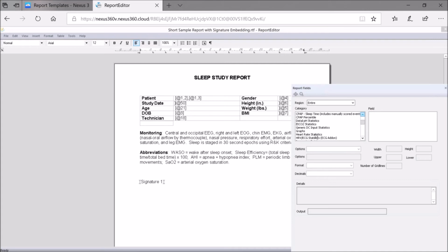So typically, rather than looking through a PDF manual or trying to remember what the code is or copying and pasting, you can select on these categories. So we're looking at heart rate statistics, and you could say, I need to find the average heart rate throughout the report, for example. And you can see here, it's quite complex. You've got average heart rate throughout the report, throughout sleep, throughout non-REM, etc. But what it's done is once I select the relevant topic of interest or indice of interest, you can see down here we've got a description. So basically saying that it's the average heart rate in a report time measured in BPM, but it gives you that code. So this is a code that is otherwise meaningless to you, but that's what Profusion is looking for.